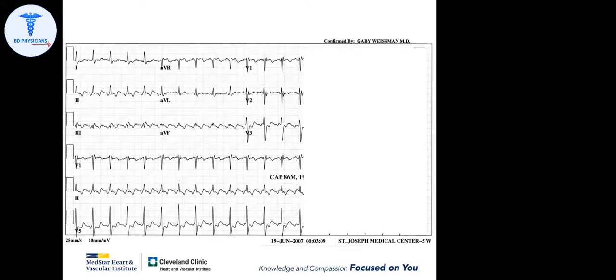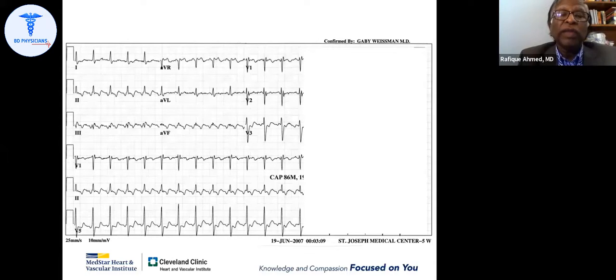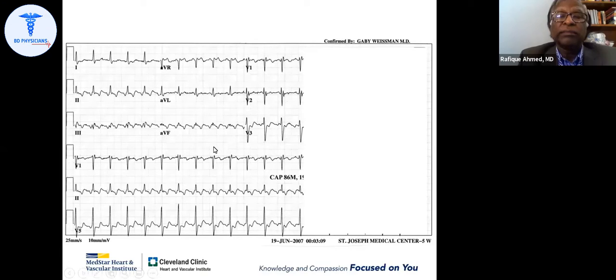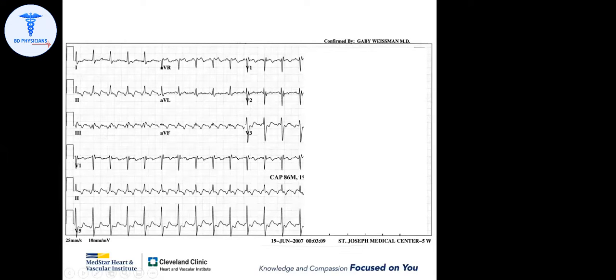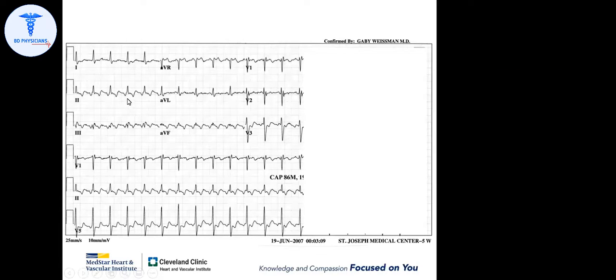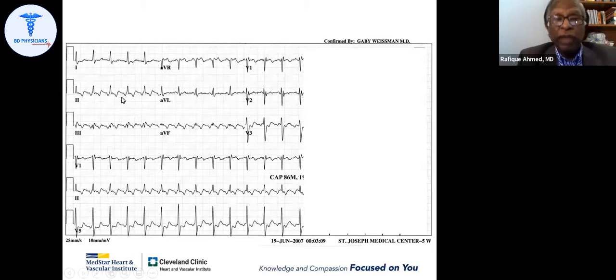Sir, I think this one, P wave, sir. Oh, next thing you look at, do you see any P wave? No, sir, I can't see any P wave, sir. Where are you looking? Which lead? Sir, lead one, lead two. Okay, lead one is totally useless. How about lead two? The P wave appears inverted, sir. Exactly.